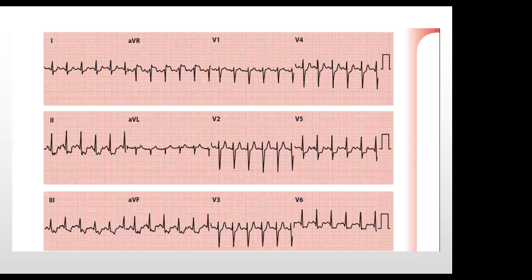Is there really a rhythm strip? There's no rhythm strip, really. Yeah, that's what I'm looking at. That will give some difficulty. But can you make anything out of it?